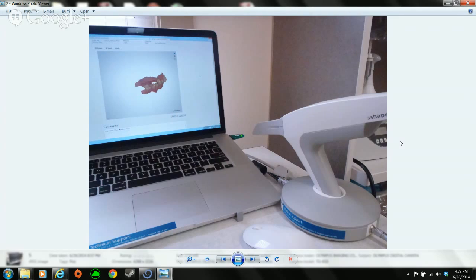We're actually going to be releasing a new build of Blue Sky Plan sometime this week that includes a parts panel. That will display, for the treatment plan that's planned, which drills, implants, metal cylinders, and drill stops are relevant for the case, and they could be ordered. There's an order now button that will enable everything to be ordered very quickly and simply and take out a lot of the calculations necessary in terms of determining the proper metal surgical tube for the surgical guide. That's something we're currently working on, and we'll have live in the next few days, actually.